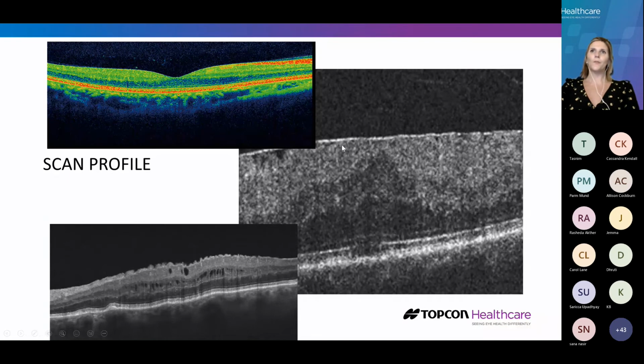In this middle image, we've got a much thickened sort of profile that we can visualize. And we've got this kind of crinkling on the top of our inner retinal section. We've lost our normal foveal depression. So therefore, this thickened retinal image is due to this ERM that's at the top. Now you can see that that's holding on at these inner retinal sort of multifocal points and is starting to change the profile of the retina. Now, again, the external limiting membrane, our photoreceptors and our RPE are intact, so the patient's vision may not yet be disrupted. There may be a little bit of disruption down here, but their vision may still be okay.